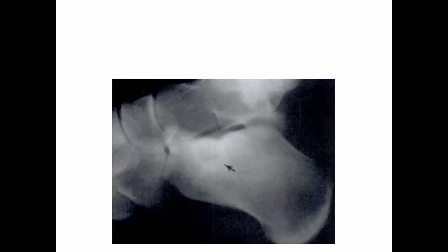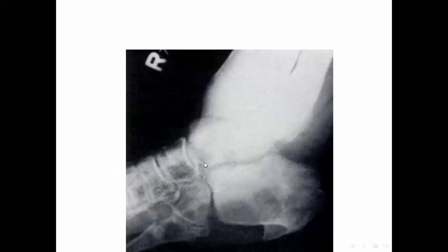This is calcification within a lipoma. It's very rare. And this is sclerosis surrounding an osteoid osteoma. The intense sclerosis here has a central lucent area or nidus. Fibrous dysplasia involving tibia and fibula, talus and calcaneum. This is polyostotic fibrous dysplasia.